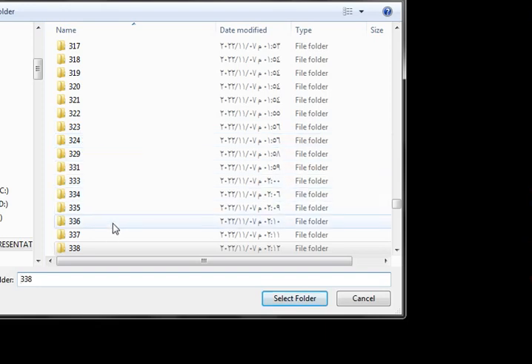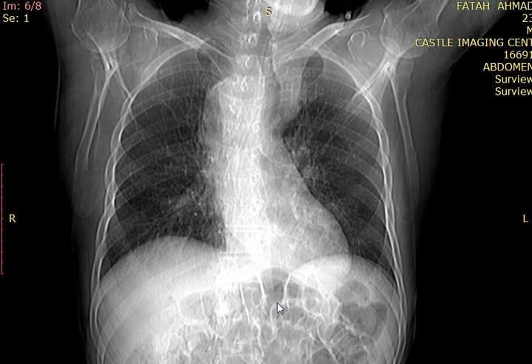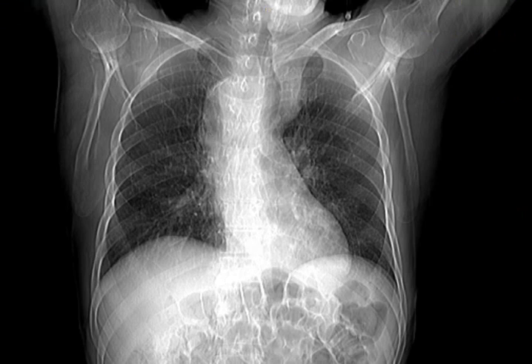Okay. This is an elderly patient presented with cough, shortness of breath, and he was tired. An NG tube was inserted, and on a chest X-ray they saw this shadow here pushing the trachea to the left side. So a CT scan was ordered.